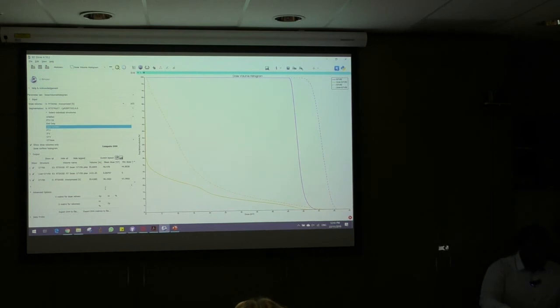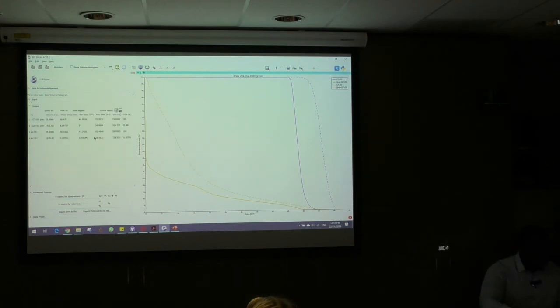And one of the cool things about this module is we can calculate a number of the different metrics you would want to calculate for dose volume histogram data. For example, the volume receiving 10 gray or more, and you can calculate that volume either as a percentage or as a cubic centimeter, and you can have the output here.